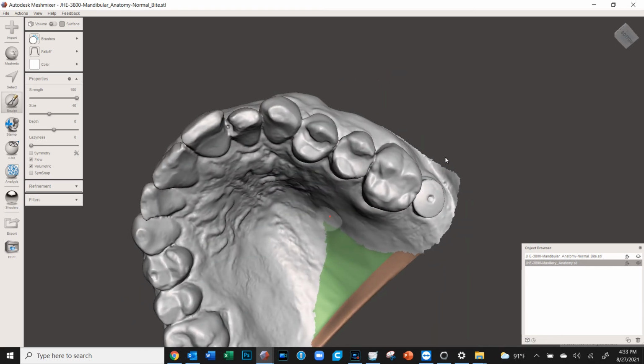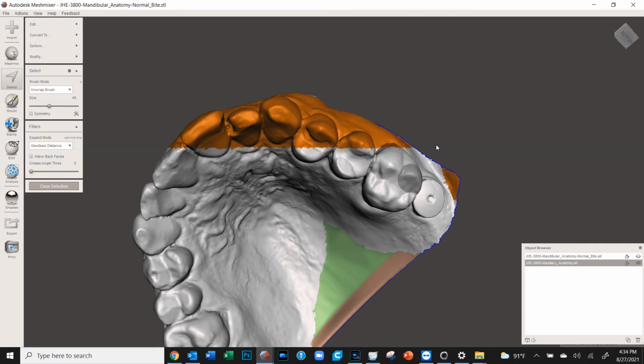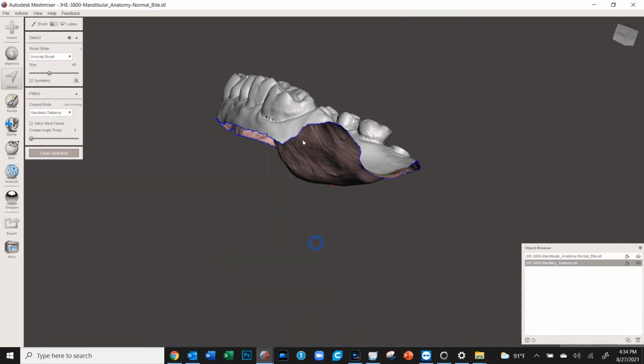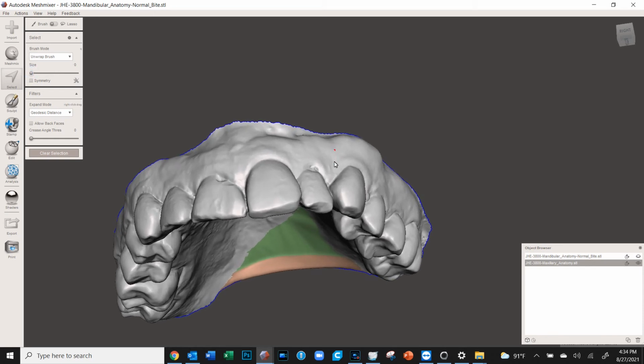Okay, so let me clip this corner a little bit more. Oh, that worked. Control Z undoes everything you don't like. Okay, so this one's now ready for us to go back through the same motions to create the base.